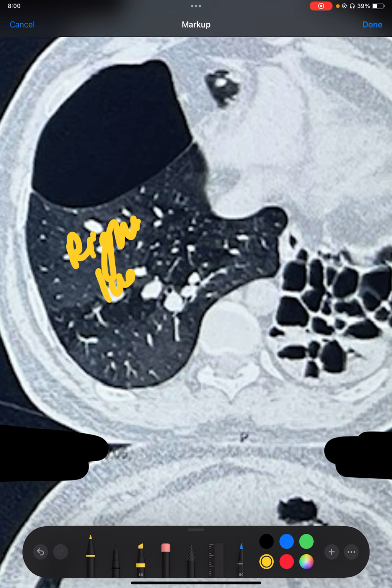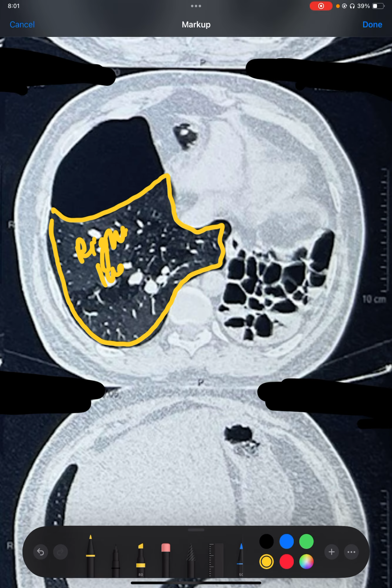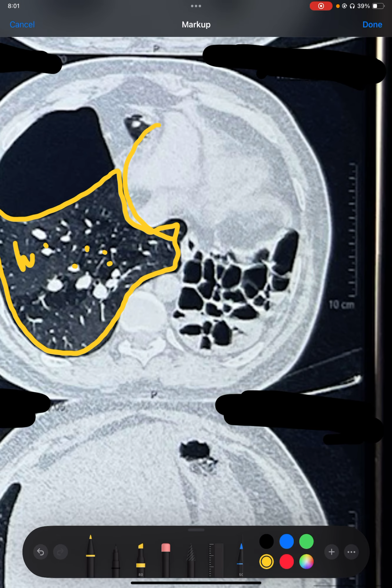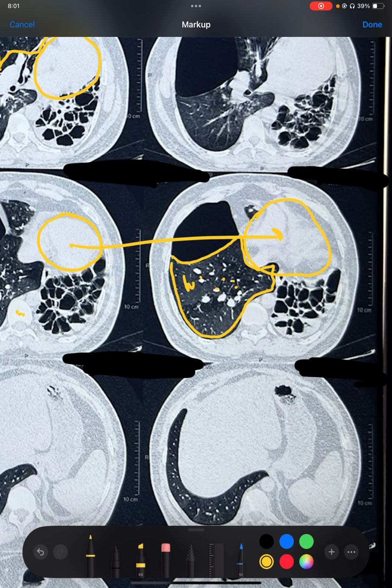This has almost normal lung parenchymal appearance, as it has these bronchovascular markings, and the lung is pretty homogeneous on this right side. But in here, this type of lung is not at all seen. See, this is all heart. This is all portion of heart or mediastinum, which we can simply trace. Here also, these are heart shadows, which we can very clearly trace.